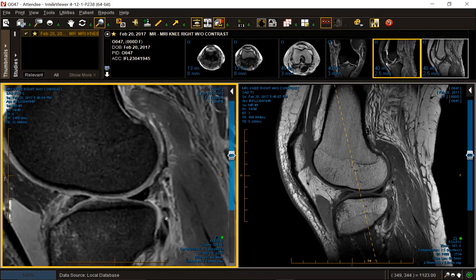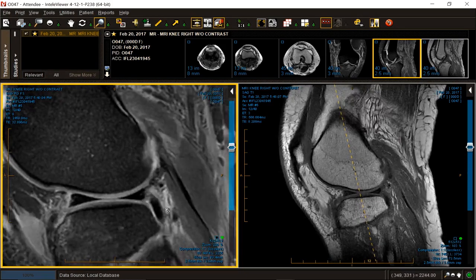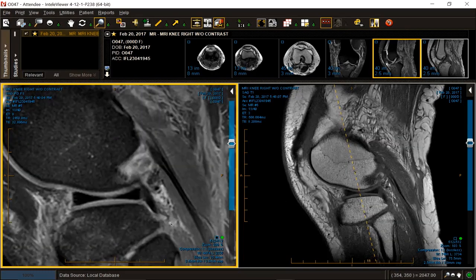We do not have a fabellofibular ligament. There's an inverse relationship between the size of the fabellofibular ligament and the arcuate ligament, which is right here and torn. And we can infer its tear by some of these wavy lines and the presence of swelling in the arcuate fossa.